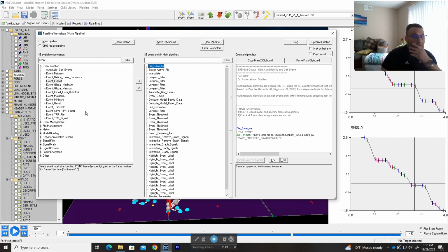And once we finish with this 201 and 202, we'll go into how you can code specific biomechanical analysis, or whatever you want to do, you can code them. I'll also provide these specific pipelines to you so you can use them if you want.